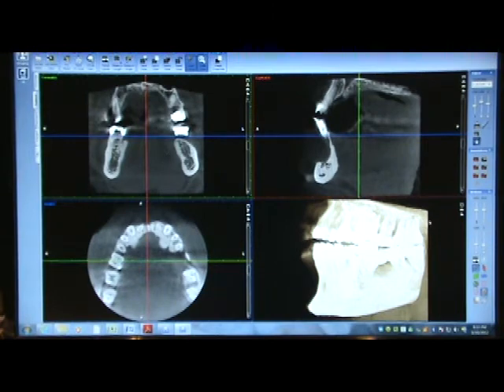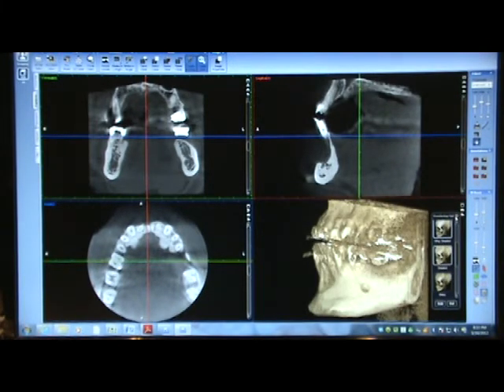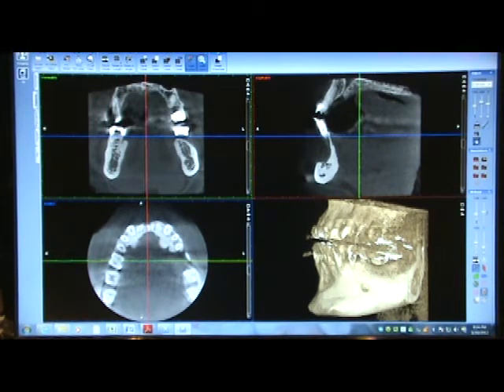Now, what I'd like to do is, on the top right corner of my model, hit the Start Rendering options, a little wrench, click, and it'll give you different rendering options. We're going to move down to Shade It, click, and then X out. Now, over here on the right, you can manipulate your model.